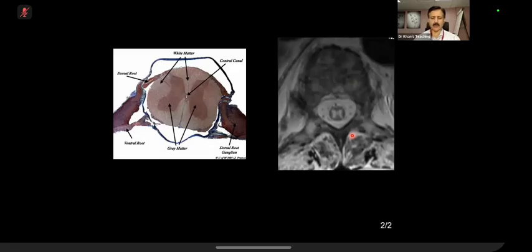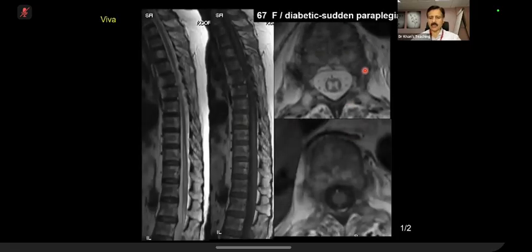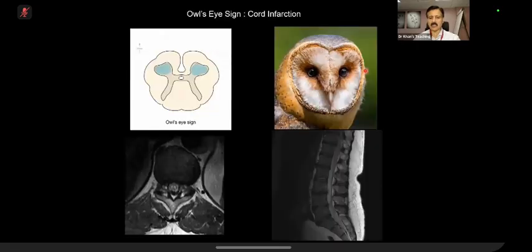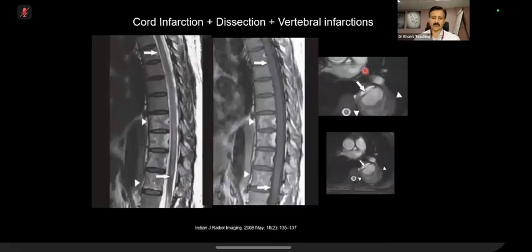You won't pick it up on imaging, but one key thing is that I had given you this history here. You can ask the examiner this history because this is key, that the symptoms should arise within minutes in infarction. In the exam, they have shown this kind of case, a long case in which there is a dissection, and with that, look at this, what is happening inside.